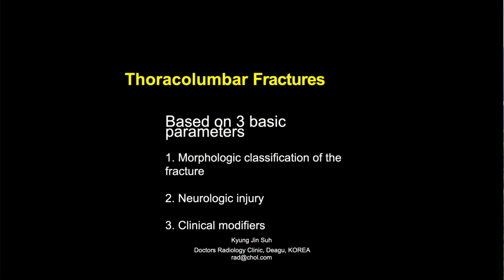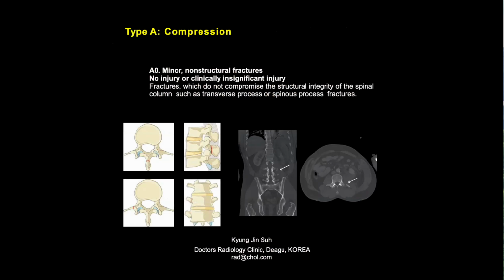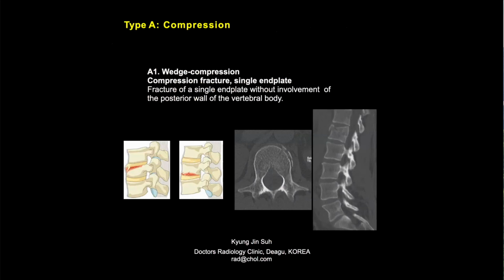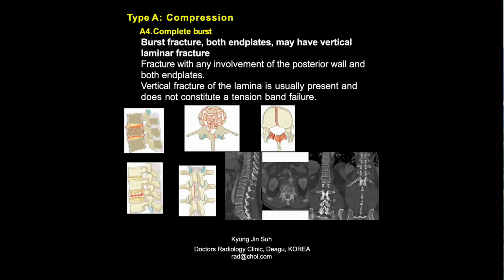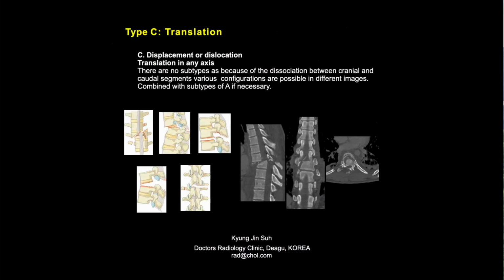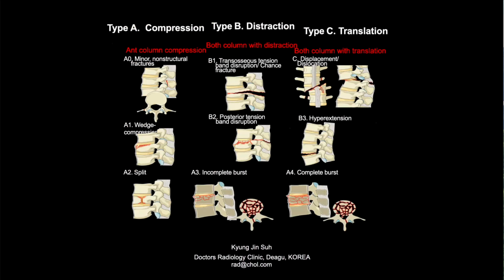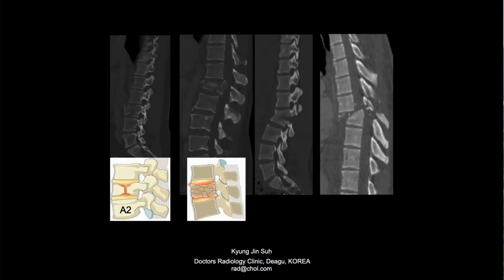And just go through this. This just diagrammatically shows that I think we've already gone through all this stuff. Different kinds of fractures that we've seen here. So again, we can see.